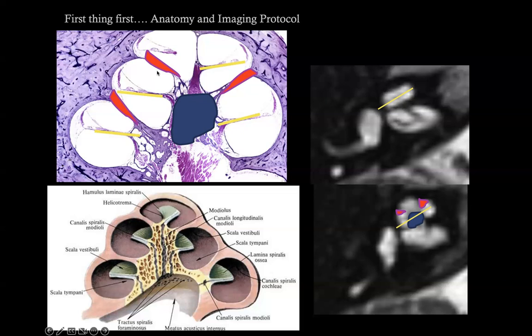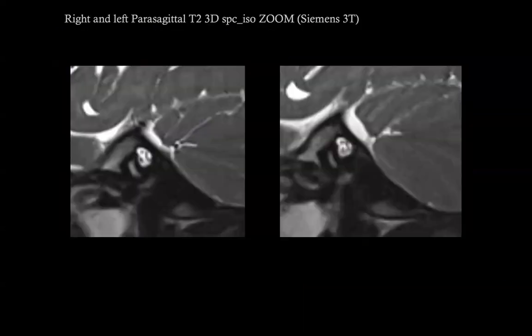Why is this so important? Because modification of this normal structure will give you some malformations that you can recognize, and you can use this pattern recognition for amazing diagnosis. Another important thing is that you need to see the nerves. So how do you see the nerves?